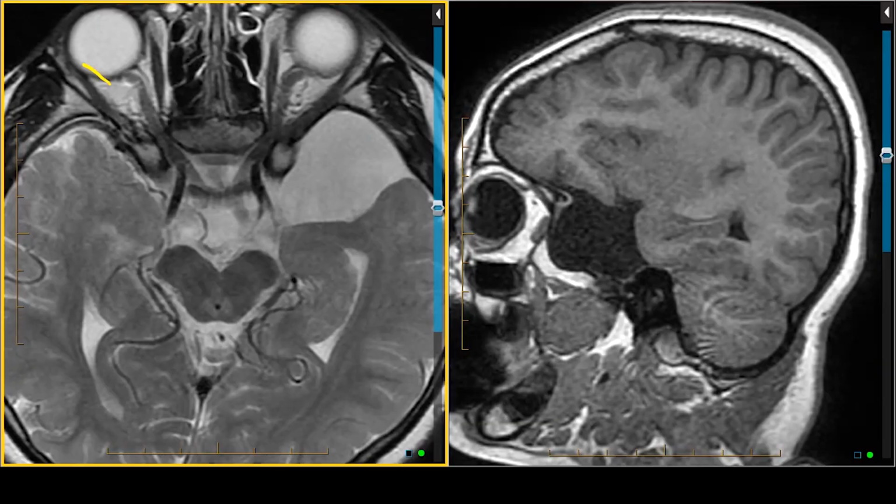We can see on the right a normal greater sphenoid wing. We can see the contour along the anterior aspect of the middle cranial fossa. On the left side, this is bowed anteriorly. In contrast to the margins of the right greater sphenoid wing, the left looks smaller. That's because there's been bony remodeling from chronic pressure from this arachnoid cyst. This is chronic low pressure, not high pressure.